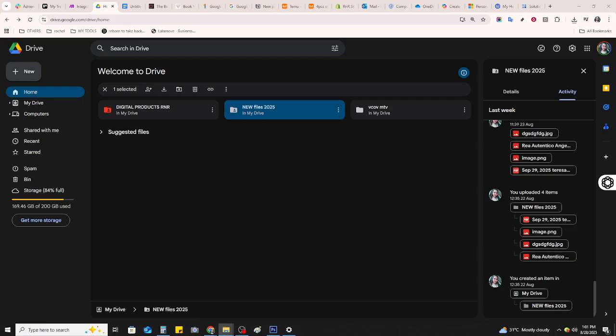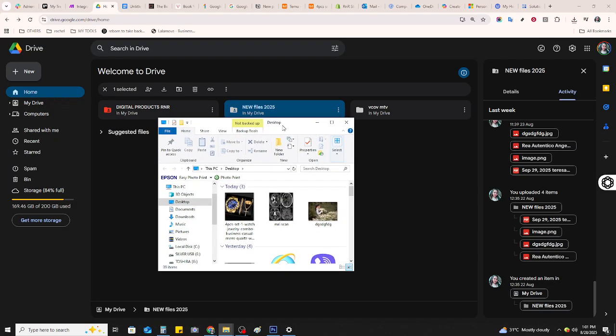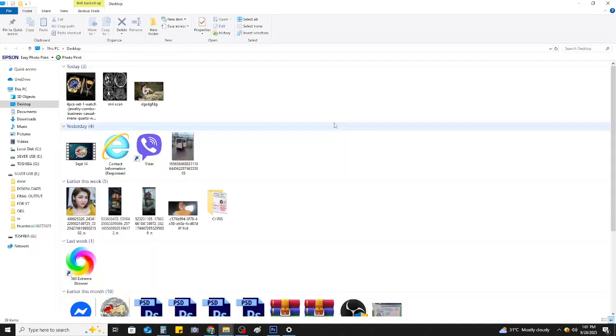Simply place the MRI DVD into your computer's DVD drive. Once inserted, you'll need to give it a moment to load. It's quite common for these DVDs to include a DICOM viewer, which is the software specifically designed for viewing medical scans, along with the scan files themselves.